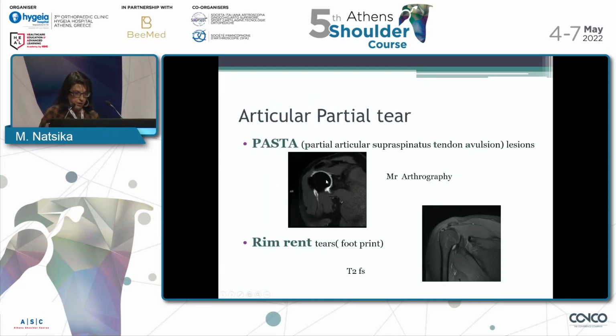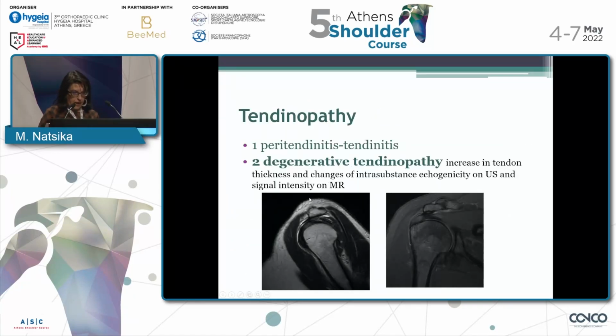We can see it here as a thickening and edematous process inside the rotator cuff fibers. And here, also we have a thickening, but it's not yet a tear. These are precursors of tear. It depends on the quality of life and the occupational problems, and if somebody is an athletic guy. So we have all these changes evolving.